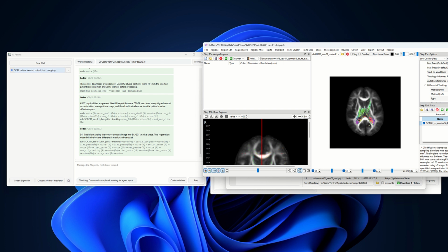One trim round is applied. I will check the surviving tract count and deleted trajectories before any further cleanup. The first trim removed no trajectories, so the map is already topologically stable.